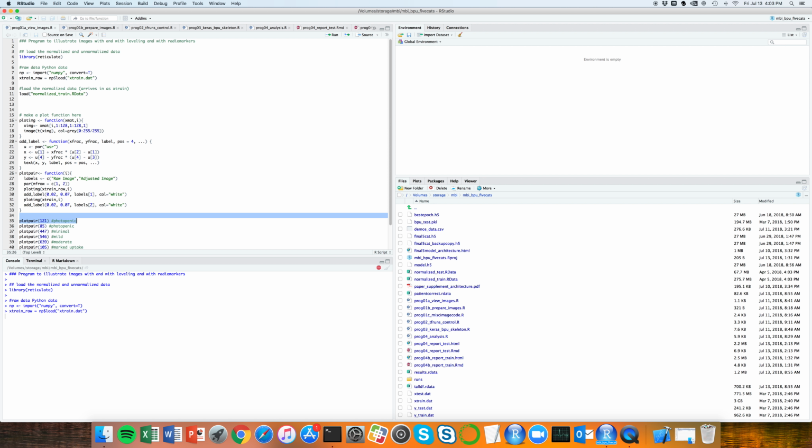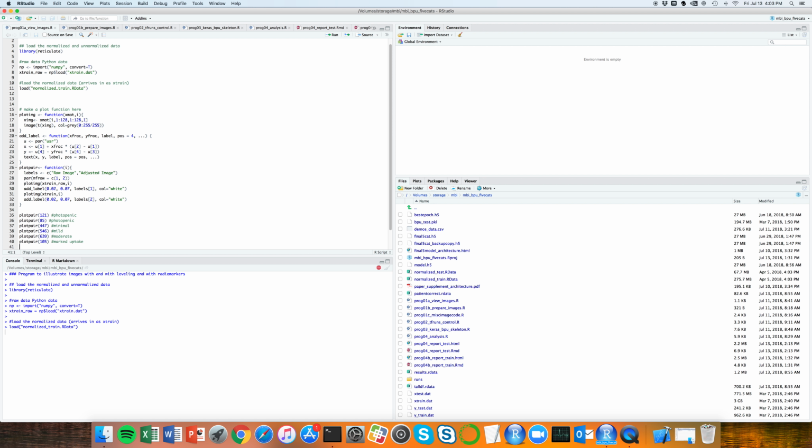So it's going to take a few moments. It's a large data file, several gigabytes worth of data. What we're looking to do is use a convolutional neural network to predict what is known as background parenchymal uptake. BPU is a radiologist's interpretation of how much tracer is visible within the breast tissue. So it ranges from photopenic to minimal to mild to moderate and marked uptake. And that's our training task.